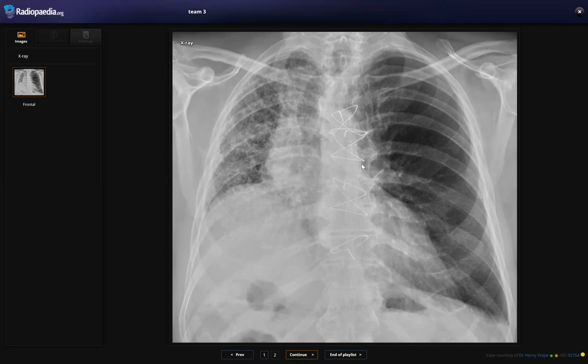And so this could be a diffuse interstitial lung disease. On the right side, the left lung is grossly unremarkable. It could be a transplanted lung, the left one, and the right one shows a marked UIP type of pattern. And the patient needs further imaging with an HRCT scan of the chest, referral to the chest physician, and I would like to take a detailed history. Why was this X-ray taken? Time is up. Yes, okay, on time, perfect.